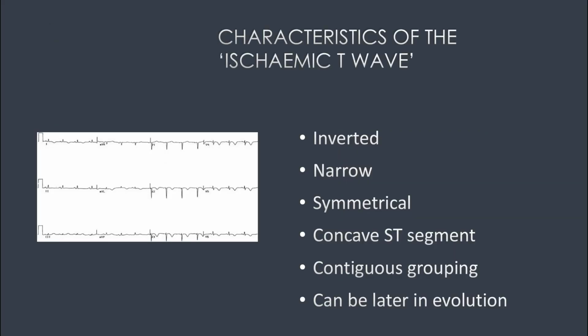The alterations in T wave morphology that are caused by this ischemia are primary changes. They are manifestations of something that has altered the action potential of the affected area without changing the underlying sequence of depolarization or repolarization. Now, this contrasts with secondary changes such as those that occur with left bundle branch blocks, where the T wave alterations are a direct result of the block having altered the sequence of events as opposed to the nature of the action potential itself.